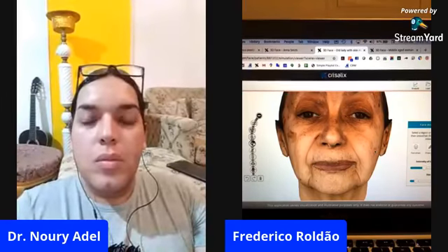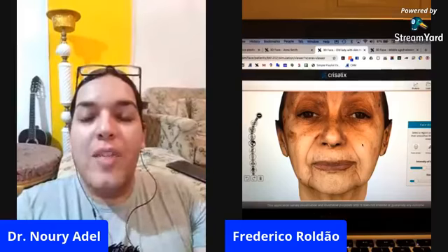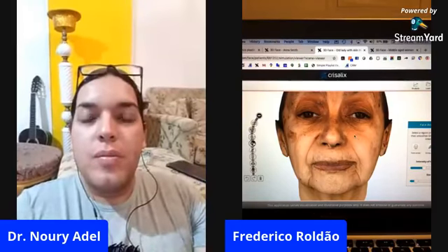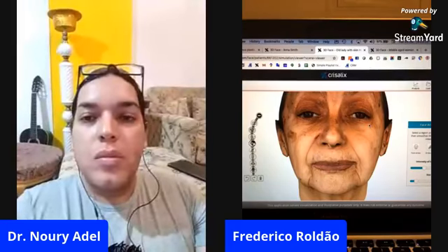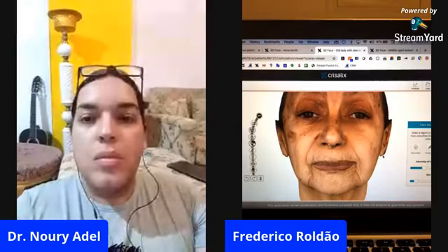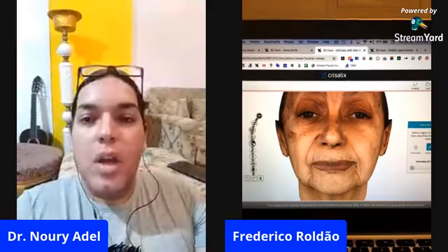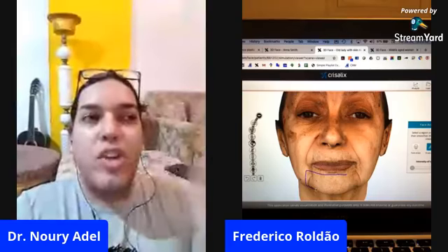I don't know if you can see on your side the pigmentation being removed, or at least improved, from the left side of the patient. Yeah, exactly. I don't want to overdo it. I just want to make it look a bit better, and also at the same time take some wrinkles away from the tear trough here. I don't mind if she looks different from one side to the other, because then we can compare the differences. I think it would be better if the patient can see how her face can change when you leave the original duplicate on the other side.